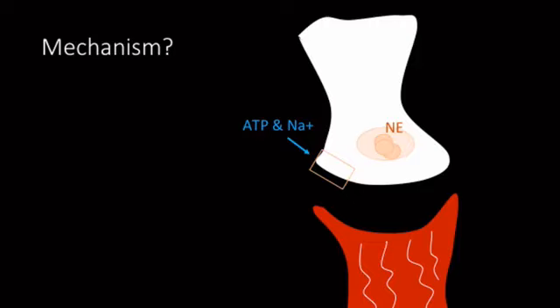The vast majority, like 90% of neuroblastoma tumors, express this receptor and therefore are MIBG active. All right, there we go. So MIBG coming up. Yep, that's right, coming in there the same way.